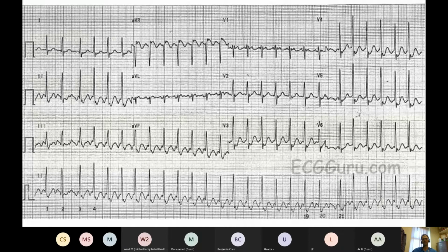So it's a supraventricular tachycardia. Yeah, I agree with that. But can anybody be more precise? So I prefer the term narrow complex tachycardia because a supraventricular tachycardia can be broad complex if you have left or right bundle branch block, and a sinus tachycardia, for example, just exercising.